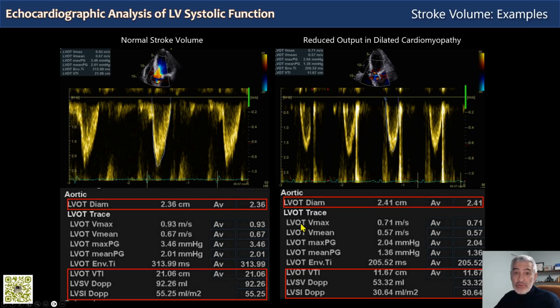So it is very important that when you input the demographics of the patient, you always also input the weight and height, so that you have body surface area, because for most measurements in echocardiography we use index values, so as to compare them between patients, and we really need the stroke volume index.